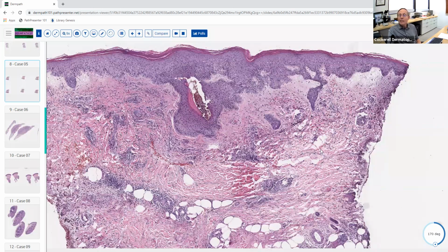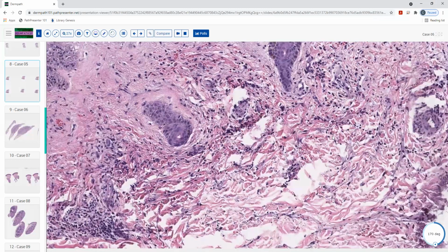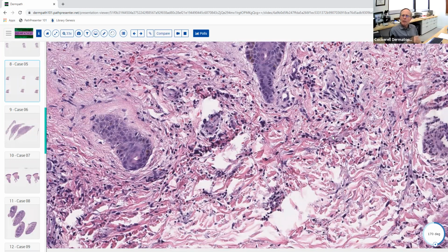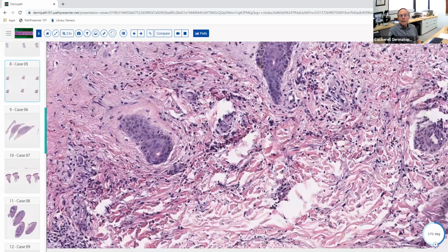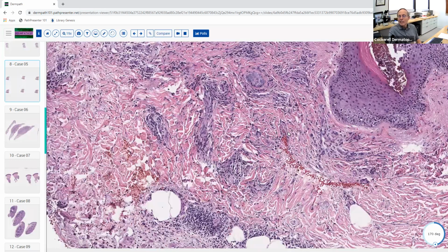So what's the diagnosis that we're describing here? I was thinking maybe this is a stasis dermatitis that's evolved into lipodermatosclerosis. But does that usually give you this mostly interstitial infiltrate with all these neutrophils in it? I guess not necessarily. You wouldn't see as much of the neutrophilic infiltrate. Yeah. And there might be some background stasis-type change that led to this process. So you get people who have bad circulation and maybe they're shaving their legs and they nick it. And the next thing you know, they've got this disease.